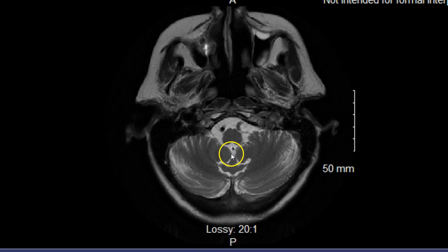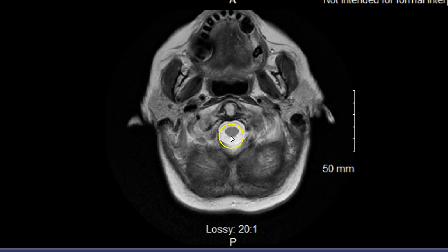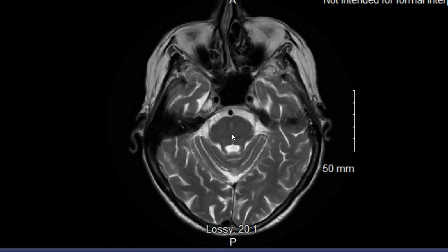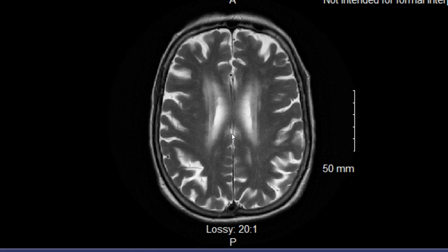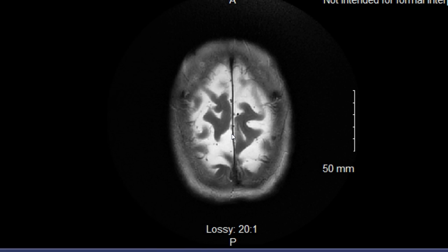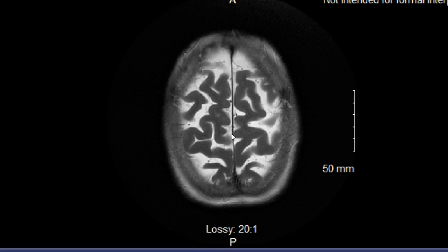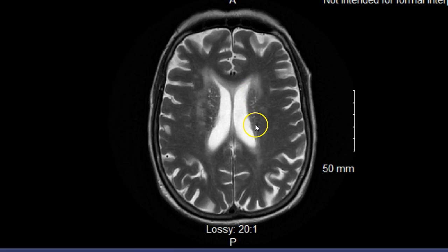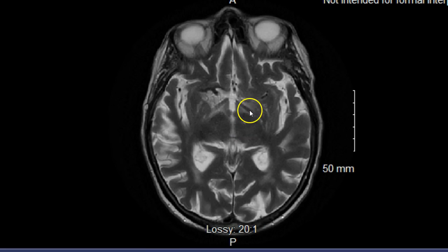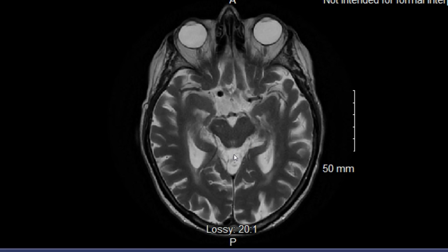And then subsequently, what I think is really cool as we continue to go through, you can see how the spinal cord, that solid spinal cord, is then surrounded by cerebral spinal fluid as well. So pretty cool stuff in that regard. But really, the anatomy is very consistent with what we saw before, where we're able to visualize the sulci and the gyrus. We're able to visualize those ventricles and those connections. We can see the area of the caudate nucleus. We can subsequently see the area of the thalamus being demonstrated here, the area of the pineal gland visualized.